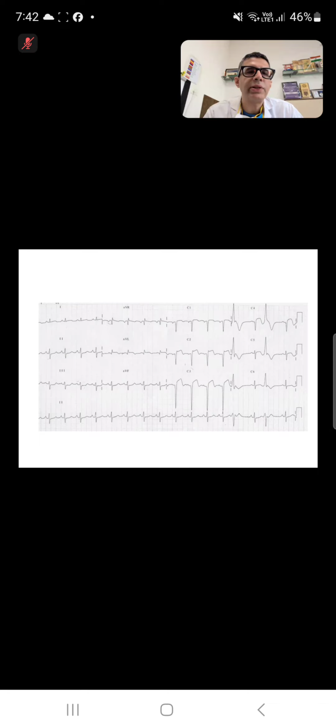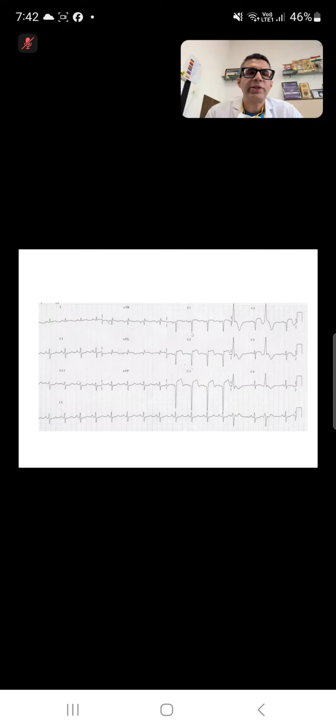Coming to ST segment, sir. ST segment elevations in lead 2 and 3, sir. Where do you see ST elevations in lead 2 and 3? Leads 2 and 3 are almost flat here. So some ST depression in V1, and V2, V3, sir, ST elevation. Chest leads you are telling? Yes. In chest leads, V2 and V3. And V4?